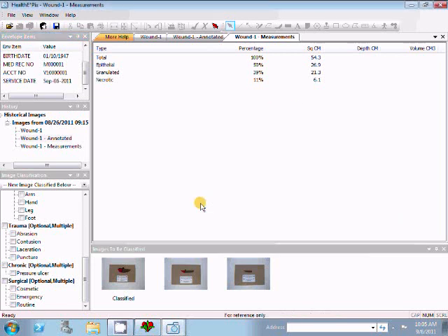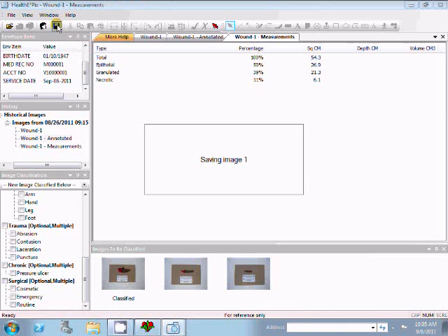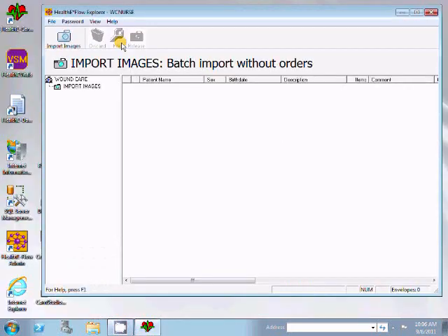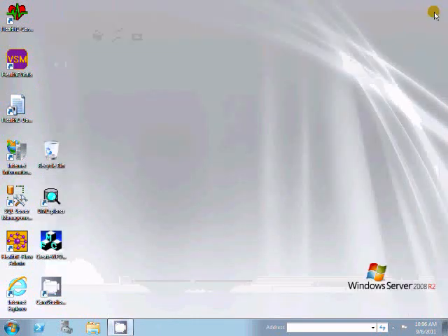When I'm all done, I click the Save button, and since the program is in batch mode, it starts over with a prompt for the next patient name. In the background, our workflow is archiving the images and associated forms and measurements, and notifying your hospital system. This notification can be used to trigger billing, perform scheduling of the next visit, and so forth. The images can then be called up by your hospital system for viewing.